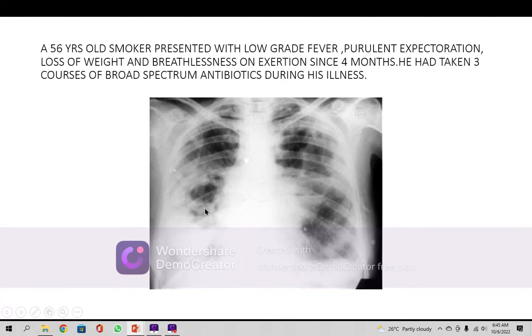Most probably it is a chronic inflammation of the lung, and that is tuberculosis causing the multiple cavitations. So we will go for the HRCT, and other tests like sputum for AFB, with culture and sensitivity, and GeneXpert to confirm, which is a very, very sensitive test nowadays. Ultrasonography of the lower parts to look for pleural effusion. If it is found, then you take it out and send it for analysis, and it will enhance your diagnosis.